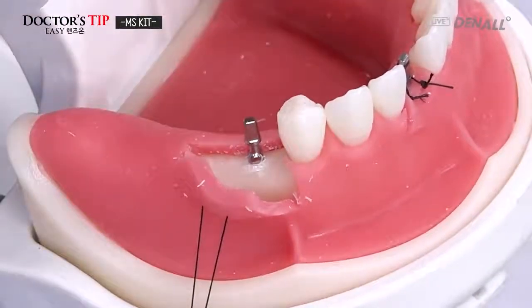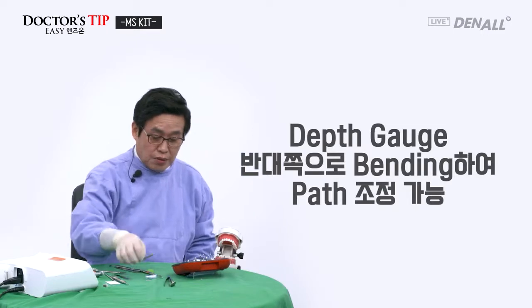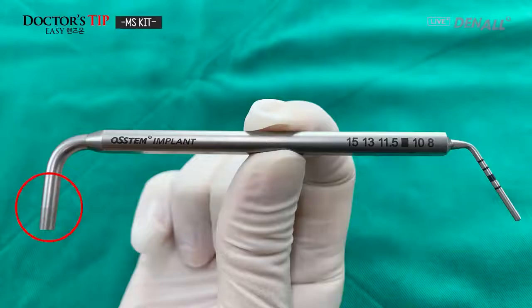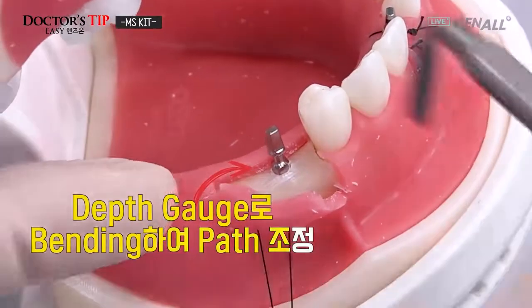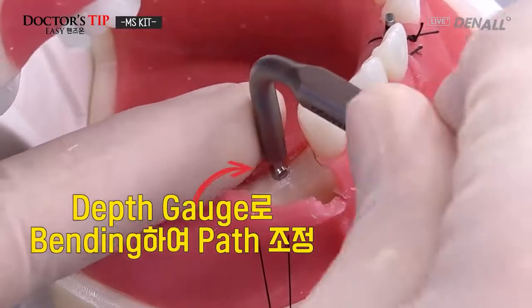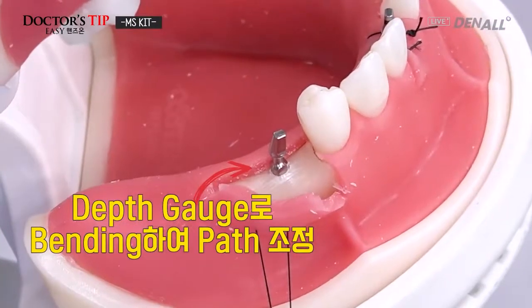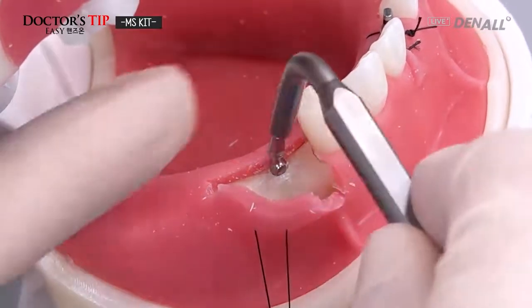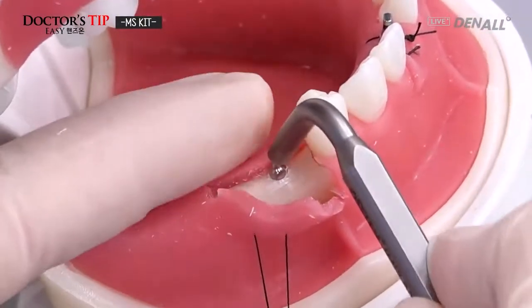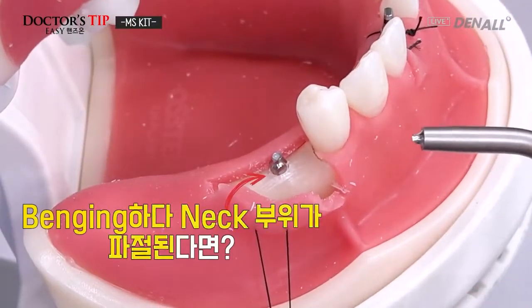And like this, in case of a provisional, if the path is not correct, the backside of the depth gauge can be used. For a provisional implant, if you don't like the positioning, then you push in the depth gauge like this to bend the implant to the position that you want. Like this. Again, it's bendable.